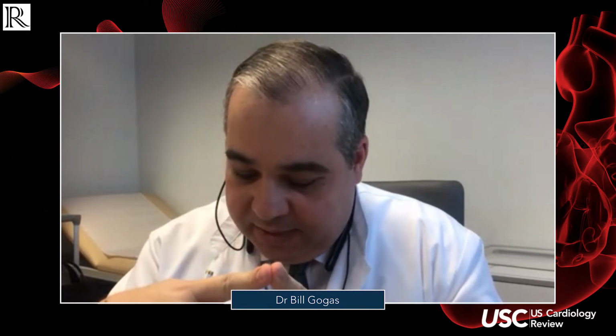I don't think there's a role for this here because there's a lesion right before the bifurcation. And also you said about the DK culotte. So we know for the culotte, the best approach is when we have the same reference vessel diameter for both the main branch and the side branch. This is also the same for the DK culotte. We need to have more or less the same diameter of the vessels. That's probably correct. But these are kind of small, and you don't want to put a lot of metal in the proximal LAD. So I think this strategy of minimal protrusion is what is most reasonable in my mind.